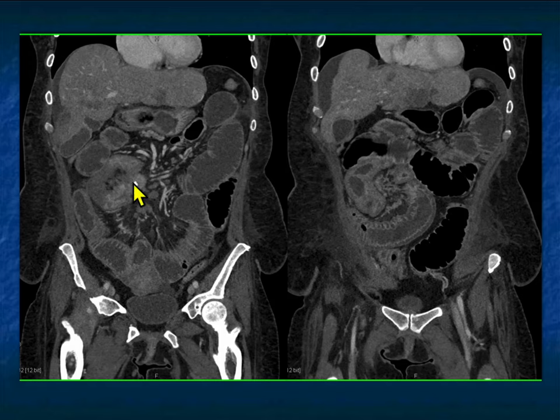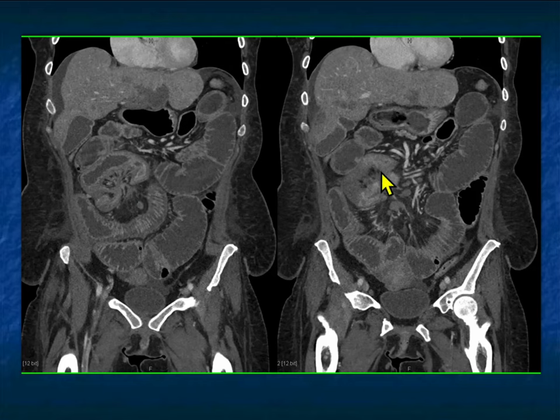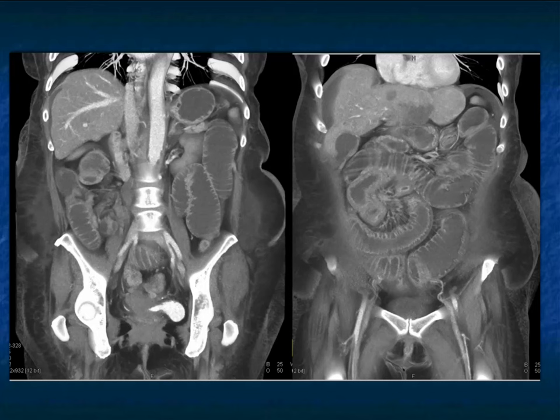But as you look more carefully, there's a mass in the mesentery with calcification, there's small nodal masses, and there's a desmoplastic reaction. And when you think about that, you're thinking about carcinoid tumors. Mass in the mesentery with calcification, sclerosing mesenteritis, and carcinoid tumors up to 70% will have calcification. Desmoplastic reaction is more common and more extensive in carcinoid rather than sclerosing mesenteritis. And here you see that pattern of desmoplastic reaction, which is causing the bowel wall thickening, and you're developing ischemic bowel. So carcinoid tumors can easily lead to ischemic bowel.